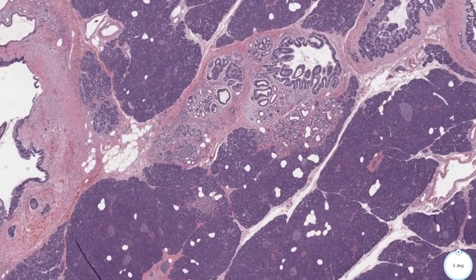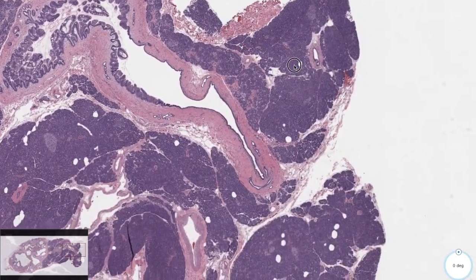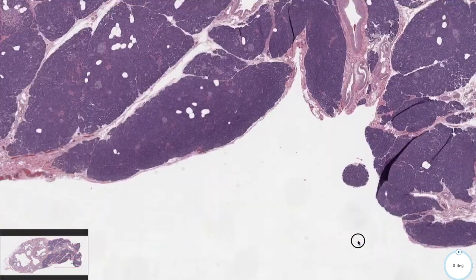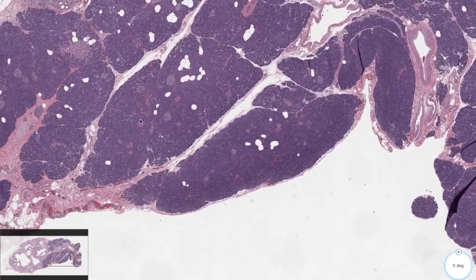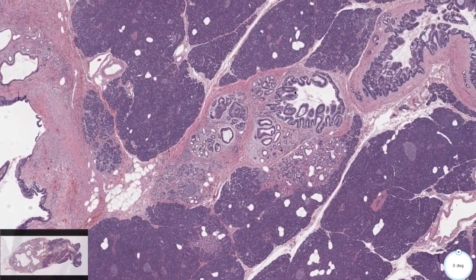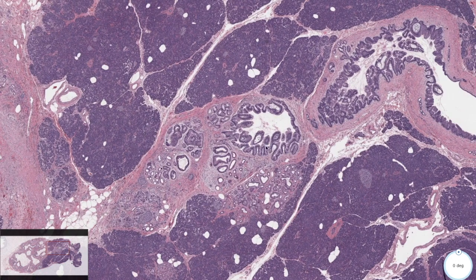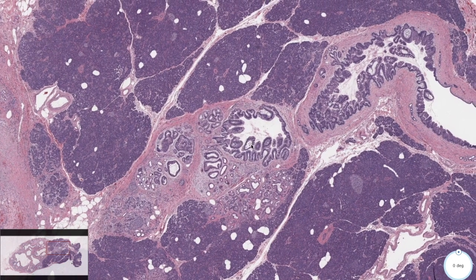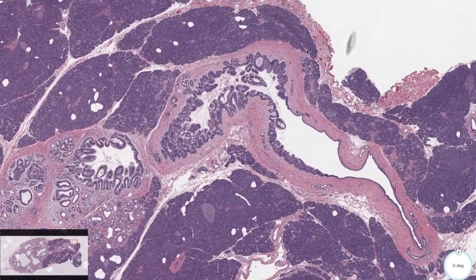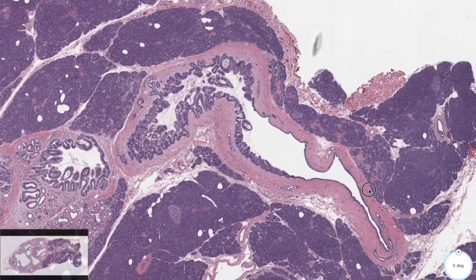Very interesting. So let's zoom in. We'll do a little low power pass over this lesion. We can very clearly see that this is normal pancreas. We can see islets of Langerhans, some fibrous stroma, more islets of Langerhans. Here we can see the epithelium. And even from this power, we can see that the epithelium is pretty abnormal. It's very complex. Ductal epithelium should not be complex.